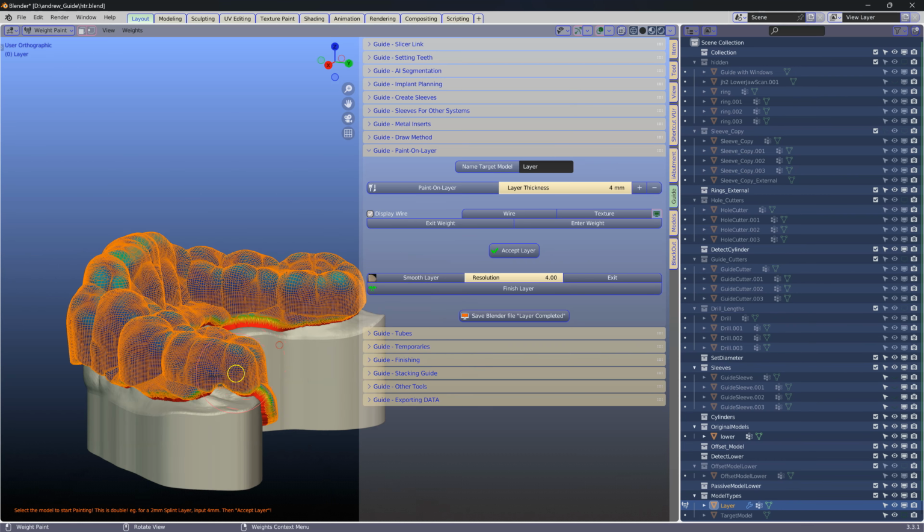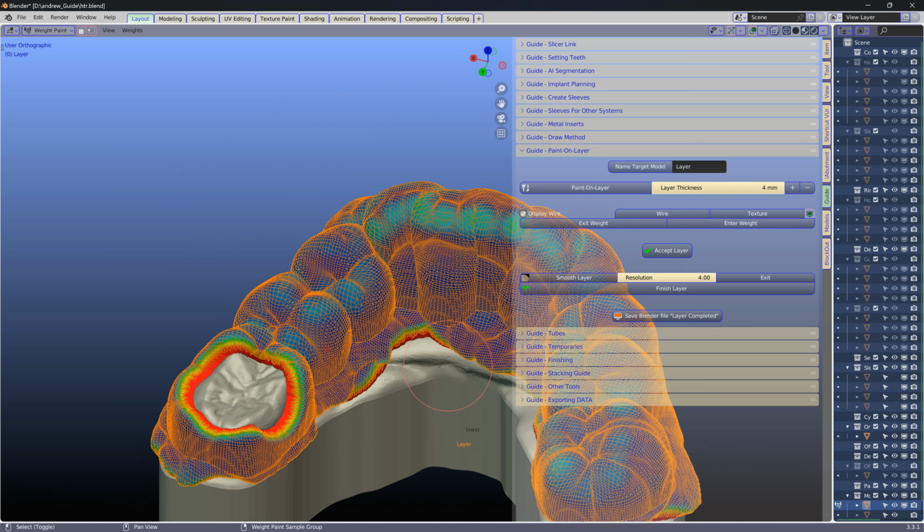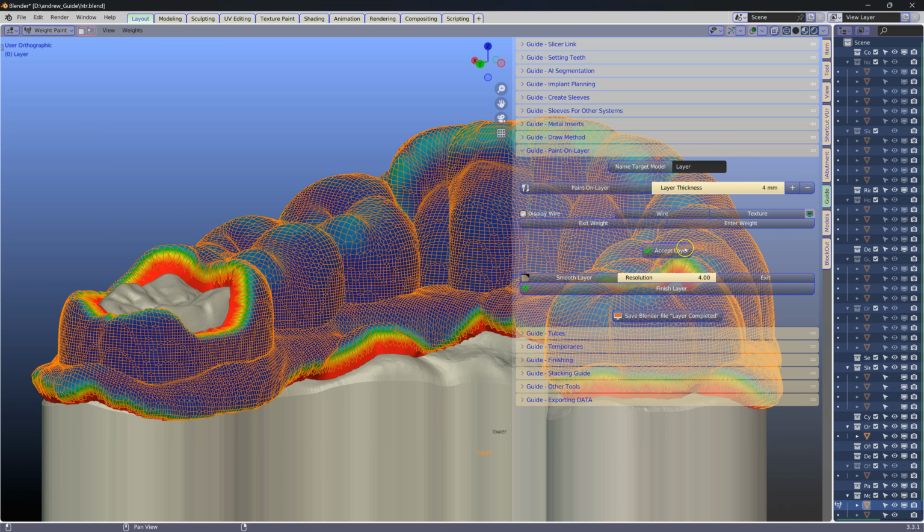Great. So once that's done, we're going to take away a little bits and pieces. So here, click on the minus sign and just dab it, and it'll make a hole. We're going to just add a little bit more on the one side and give it a little bit strength on the other side.